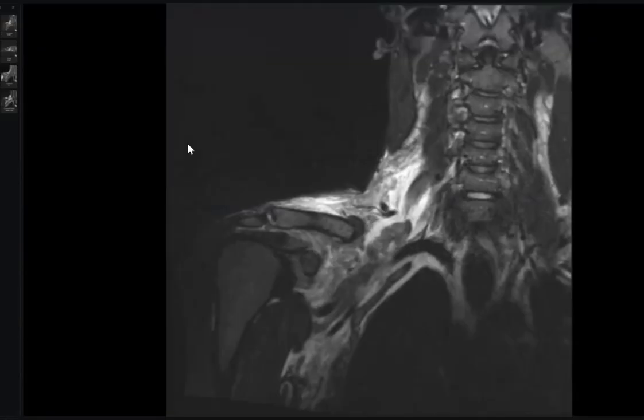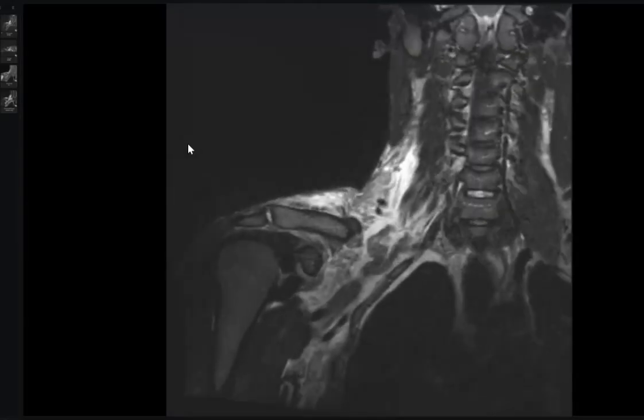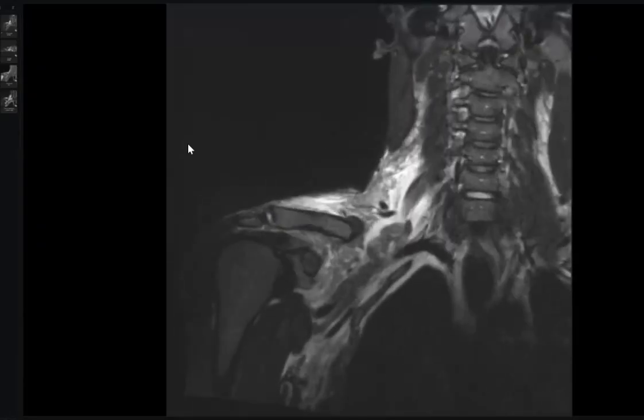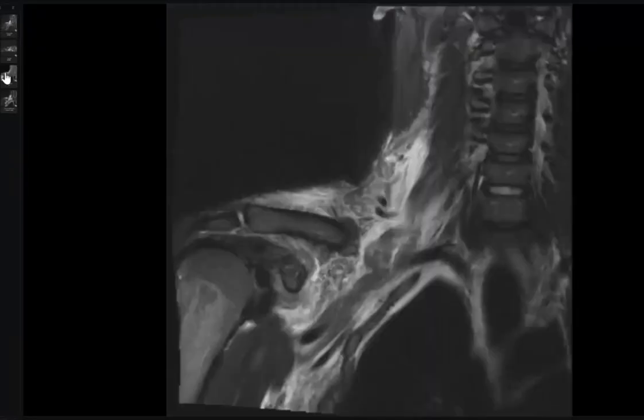It is post-traumatic denervation injury with fatty atrophy, fatty replacement of the muscle. Post-traumatic fatty atrophy of the muscle. Okay. Thank you, doctor, so much. It is also a difficult case.